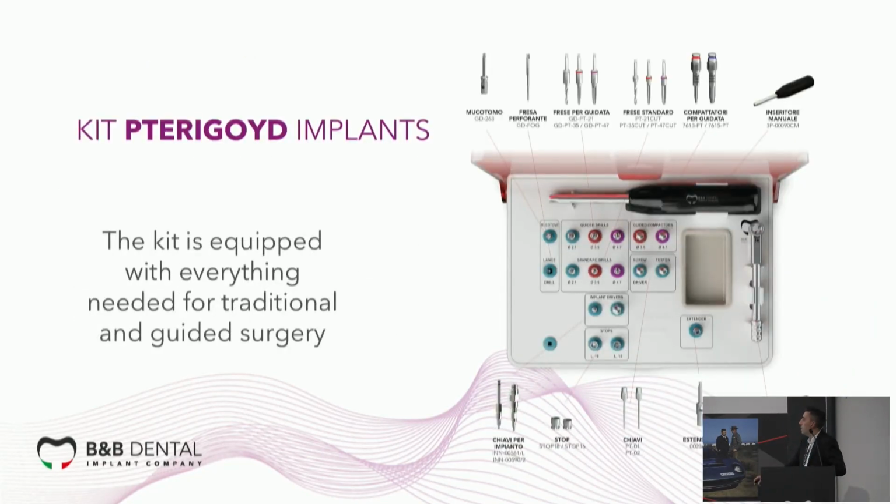This is the kit. A kit is completely of drills for guided surgery and drills for traditional surgery. Compactors for guided surgery and traditional surgery, ratchet and straight manual keys. And it's complete with all the tools, all the drills that the doctor needs during the surgery.